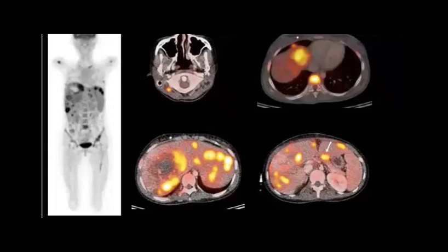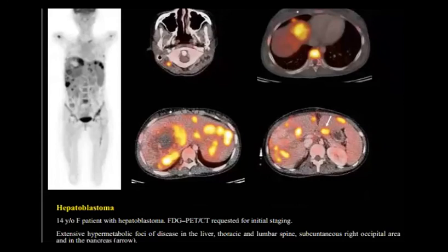So if it is primary, then you consider it as hepatoblastoma. Yes, perfect. The most important thing is to look for the age and for the aggressiveness. In the clinical laboratory, you will check for the alpha fetoprotein. If it is high, then you are going to mention that it could be hepatoblastoma.